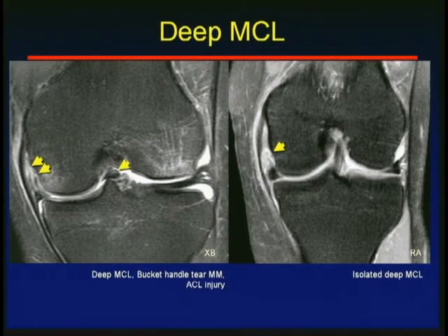In this patient here, we can see that in addition to the meniscal pathology and valgus contusion on the lateral side of the joint, the meniscofemoral component is abnormal. Now, when it's injured in isolation, that rarely results in any significant instability. There may be some very low-grade strain in these upper MCL fibers, but this type of injury is not treated surgically. Similar here, superficial, probably very low-grade strain. There's some signal in it, but the deep is disrupted.